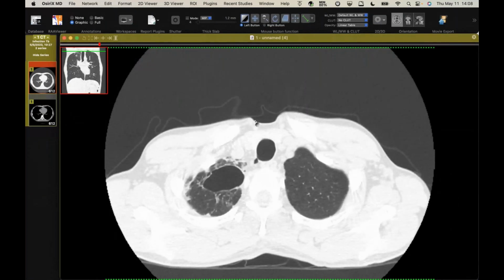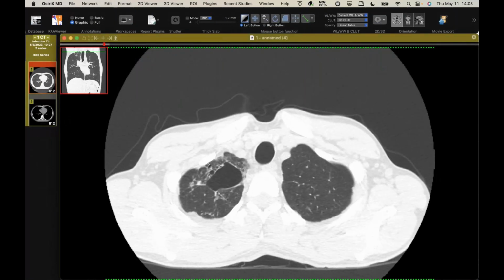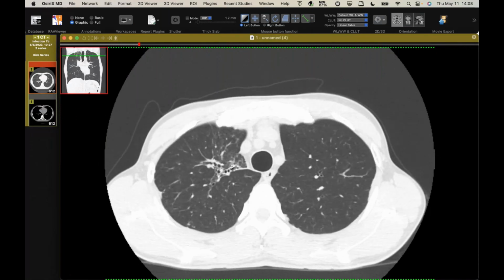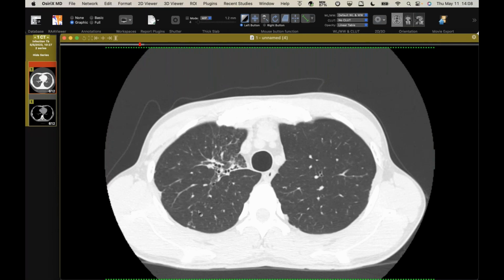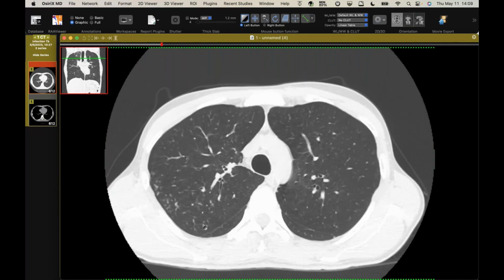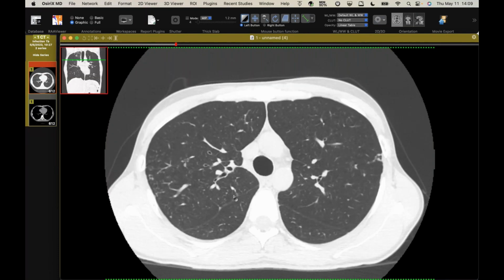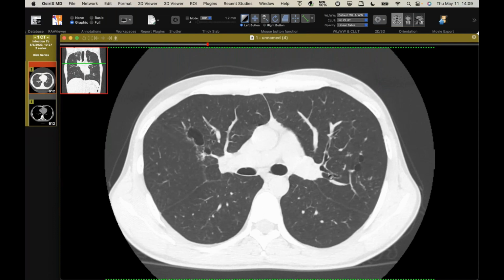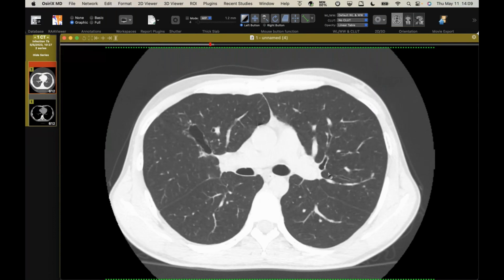The next case is a 29-year-old who also has tuberculosis. You can see there's a thin-walled cavity in the right apex, and it's associated with bronchiectasis and volume loss, but then has the same finding here. You see these little clusters of centrilobular nodules sort of away from it, little tree and bud out there, and there's even some on the other side. So this is another case of sputum positive tuberculosis in a patient with previous disease.